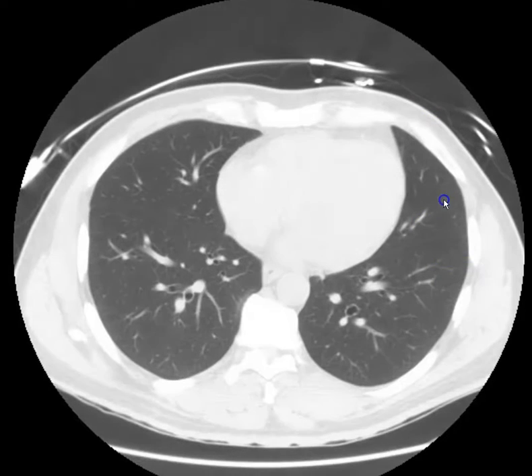You can also manually change contrast and stuff, but doing the windows helps get predefined levels. When you do this, you get a better view of the lung tissue if you put on a lung window, but you don't get a good view of anything else because it just gets washed out. So here, what do you see? What are these dark spots?